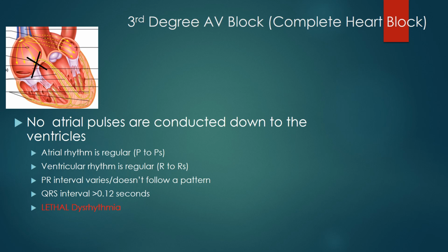almost seeming oblivious to the fact that there's a problem below. So imagine the ventricles sitting there with no signal. The AV node has blocked all of those P waves. So in a sense, you can think about the ventricles beginning to panic. No one's sending us a signal, so they begin to rescue themselves, but not very well.